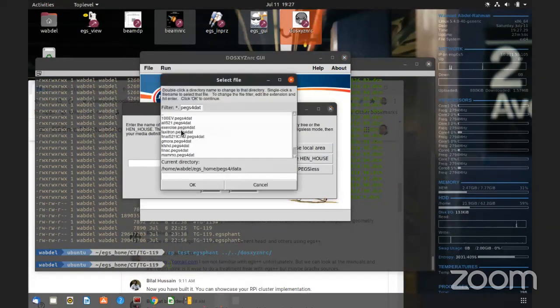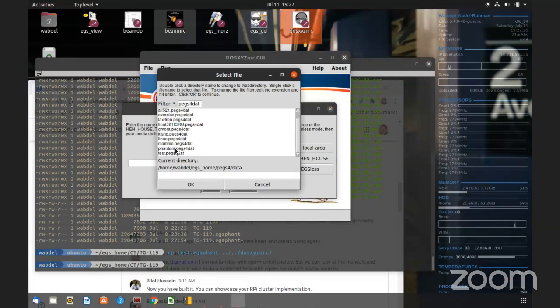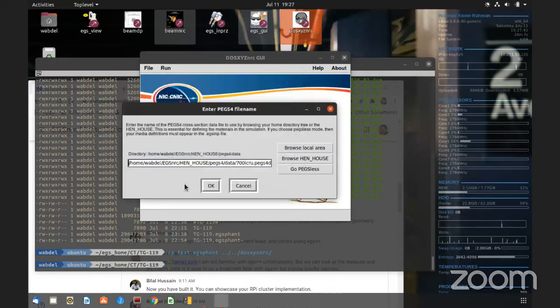I think this is trivial. I mean, now you should be experts on this. So I'm going to use, actually, a different file because I've used their default, or, you know, they have generated for me that ramp, which has the material names that is in the 700, it's in this file.